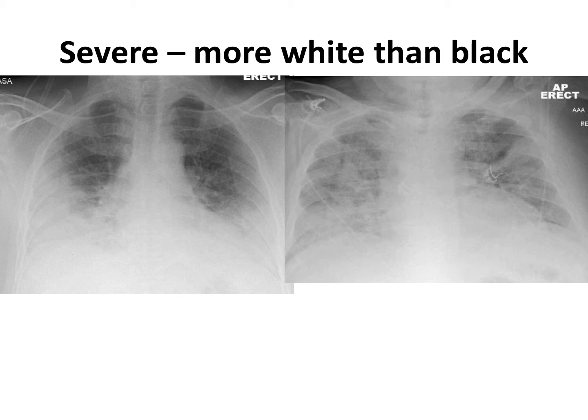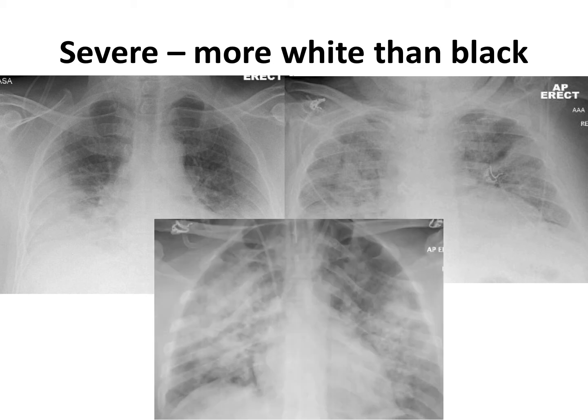These patients have severe COVID-related disease with more than 50% of the lung involved. It's got a mid and lower zone predominance on the left, a bit more diffuse on the right-hand image. This patient clearly has severe COVID-related disease. They're intubated and have central lines in place and extensive bilateral patchy areas of consolidation. In that case, it doesn't have a peripheral predominance.